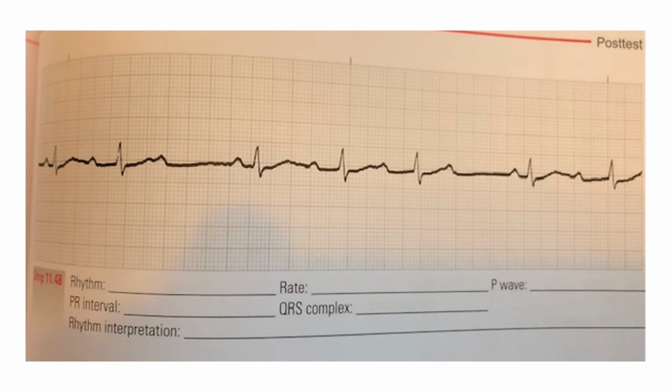In this rhythm, 11.48, it is considered irregular. The atrial rate is regular, but the ventricular rate is irregular. So there are more P's than QRS's, as you can see, and that means we are in a higher grade block. So let's do the heart rate.